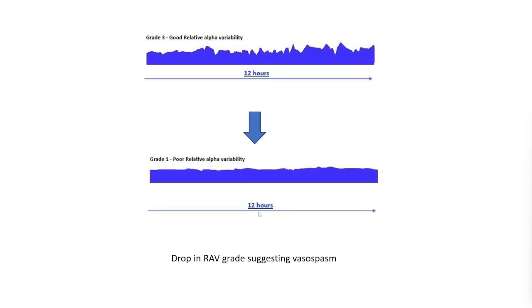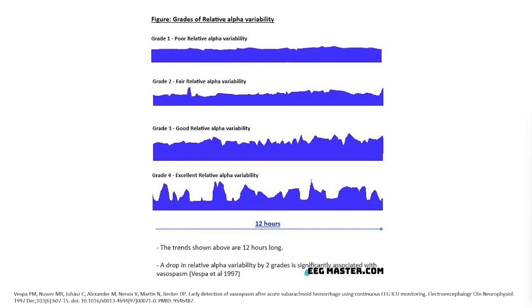After obtaining an initial baseline, excursions from baseline occurring once per hour or of greater than 15% of median value are graded as 4 or excellent. Excursions of 10%, at least every 4 hours, are scored as 3 or good. Smaller and frequent excursions are scored as 2 or fair, and no excursion greater than 2% is scored as poor or 1. In practice, grading based on this visual template can help in qualitatively grading the variability.